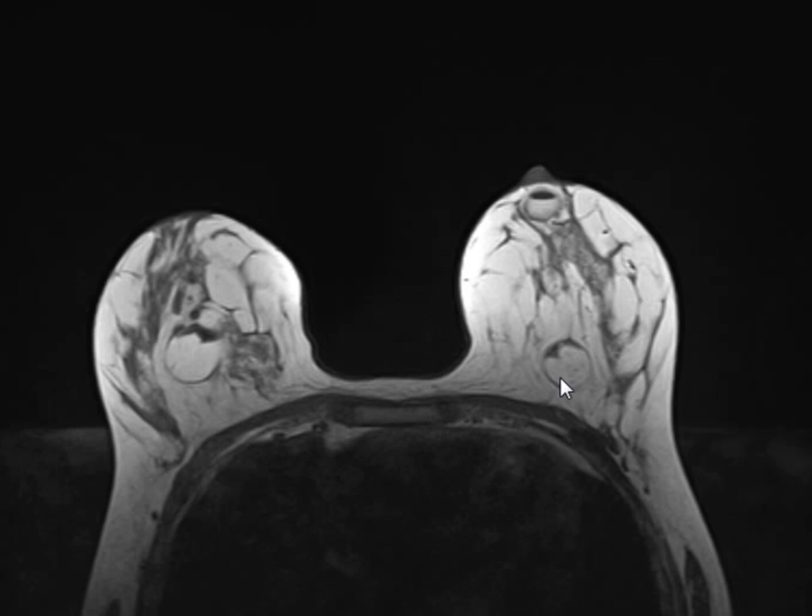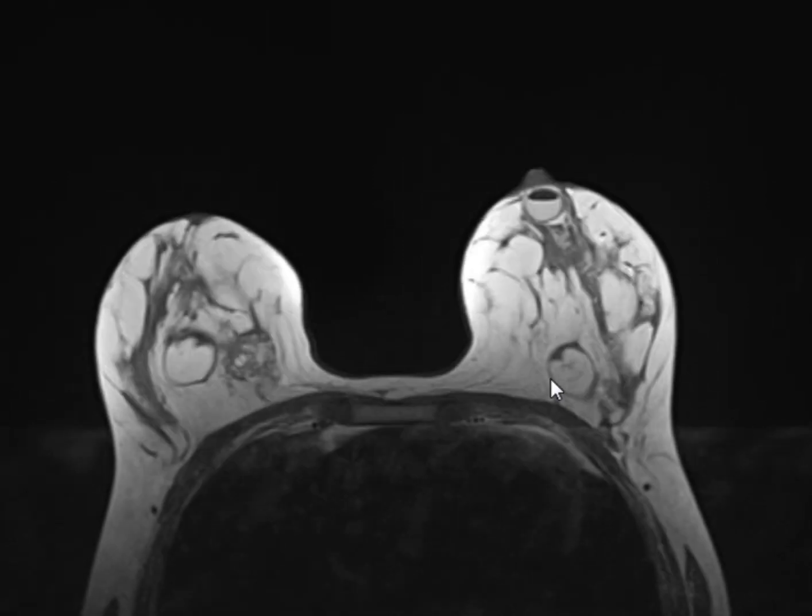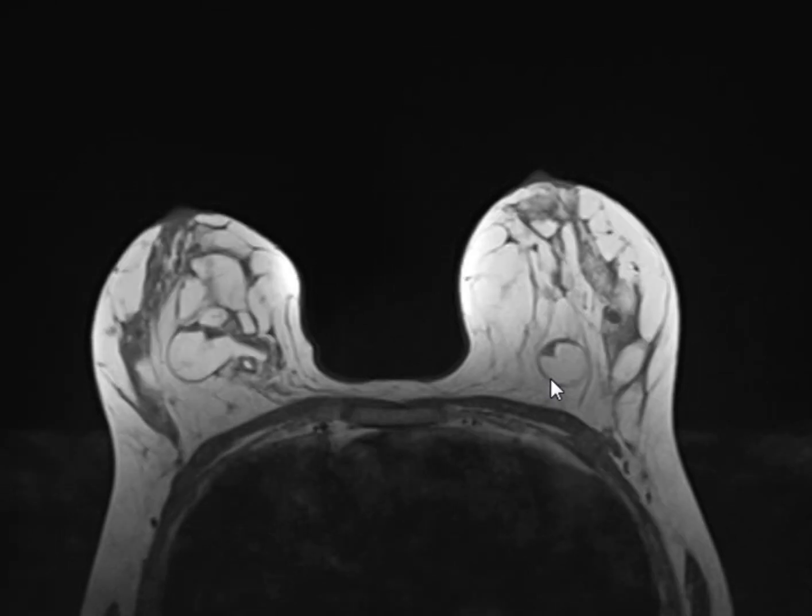And what about T2? Hypointense to the fatty tissue? Fat suppressed in T2. So you have like 200 sequences here. You're seeing only two. Why not see the rest of it and make a better idea?